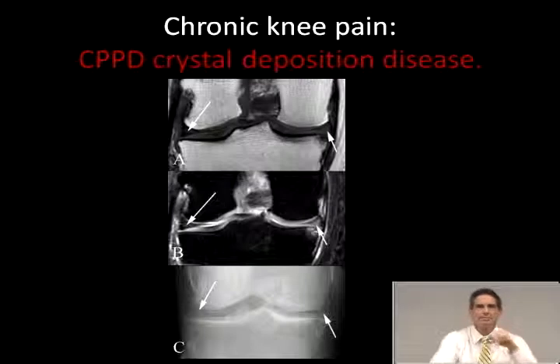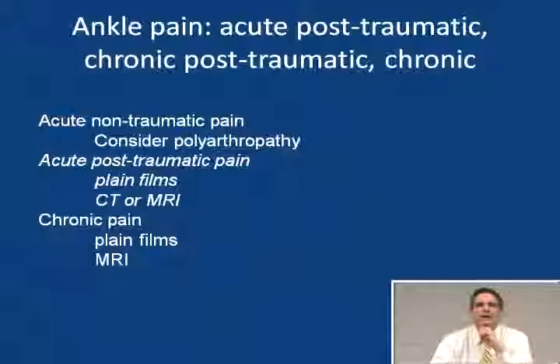Here's a composite picture of the MR and the plain films, which were inappropriately obtained after the MR rather than before, leading to some misdirection on what the exact diagnosis was. All right, we're getting there.